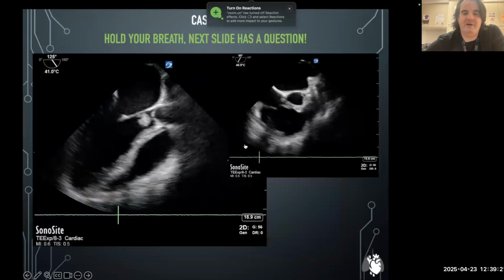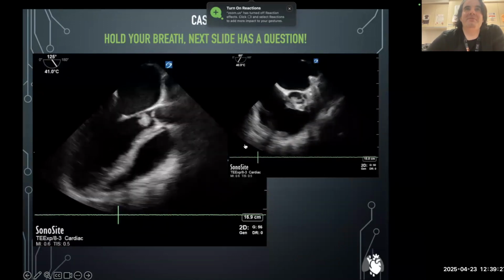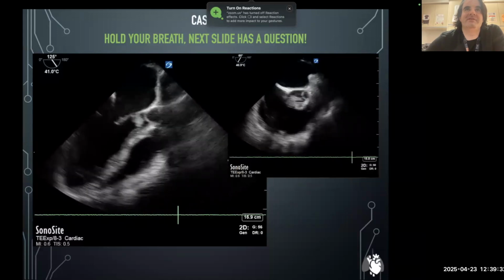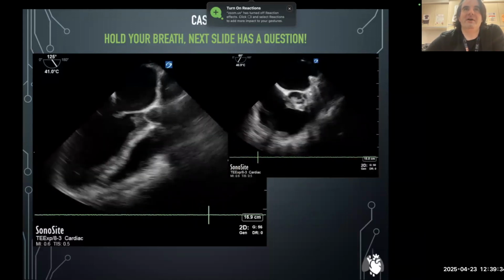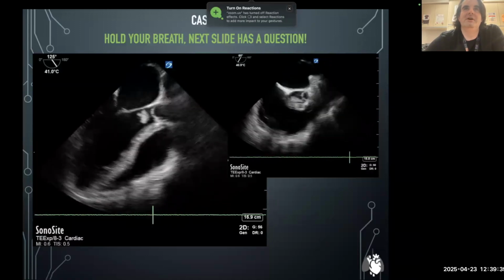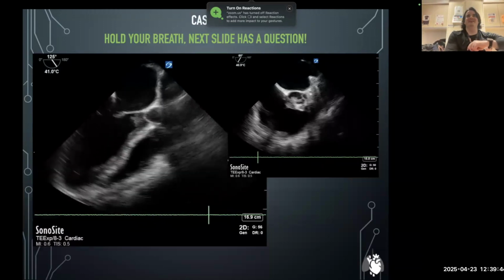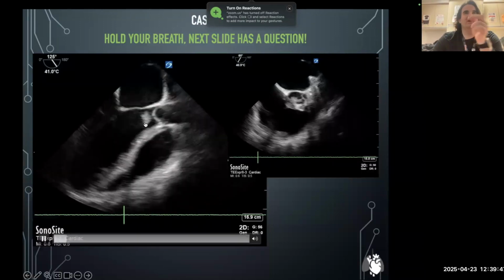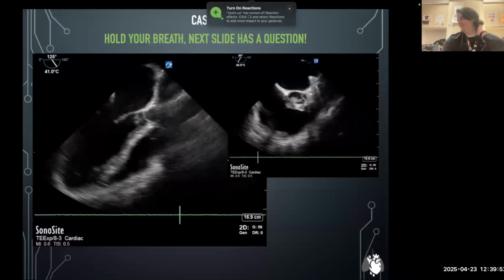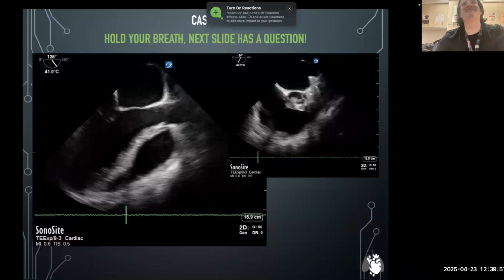There's less here than there is here. So this was certainly the point of concern, given the story. Okay, and again, he wasn't terribly stable. So what do we see here? It's normal, move on, right? Nothing to see here. So yeah, Dr. Gamble, as a cardiologist, what's your diagnosis? Here's a white blob. Technical terms, yeah.